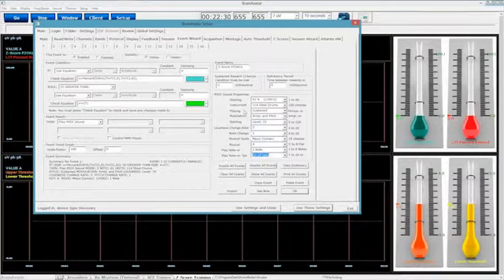So that's the basics of the Event Wizard right there. As I was going over with you guys, there's not much change over doing the classic way. If you were loading up Focus and doing some SMR training and making some changes, you might say, you know what, I don't really like this. I'd like to have it for 1 second global sustained reward criterion, and I like to do component sounds on it. That's the Event Wizard. You're basically doing the exact same thing, except you have finer tune and finite control on it. And that's the benefit of using the Event Wizard over the standard amplitude style training.